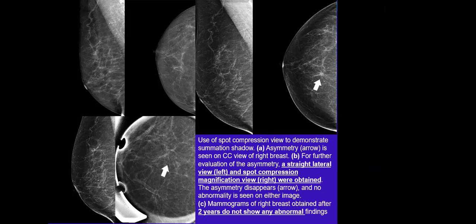When we have seen an area of asymmetric findings in a single view, we have to look in the other view, searching for the same area of asymmetric findings. Do you agree? Yes. When will we be confident enough that it is definitely not in the other view?